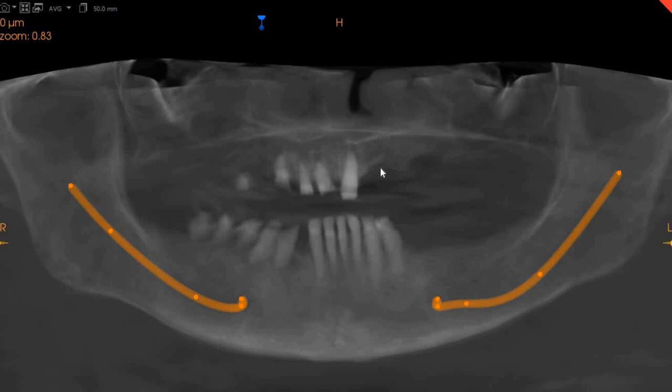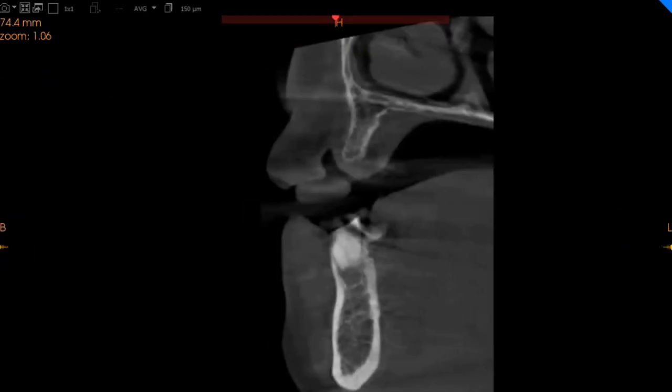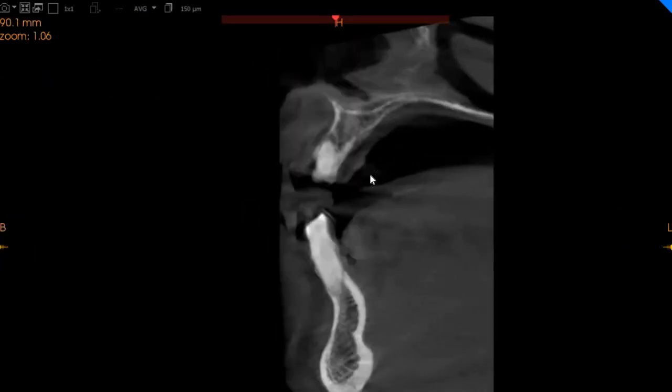On the maxillary arch, you can see we've got the remaining central incisor on the upper left hand side, and then we've got edentulous spaces on the upper posterior right and left quadrant. Now, the transaxial view is basically the proximal view. This is the central incisor here. Implant placement is definitely possible.